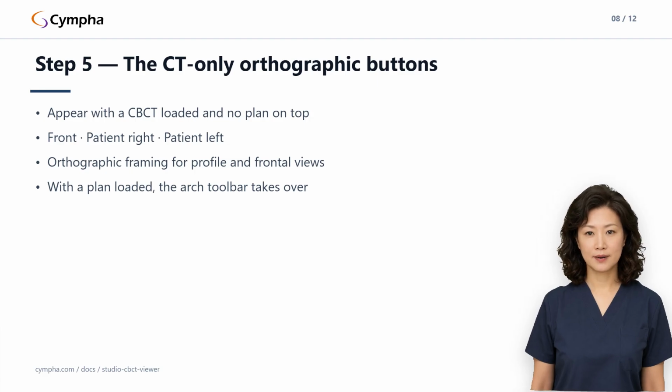Turning the tool off merely hides it and keeps the geometry. Once the curve is complete, the Pano button lights up. Click Pano in the MPR mode buttons and the slice row reformats.